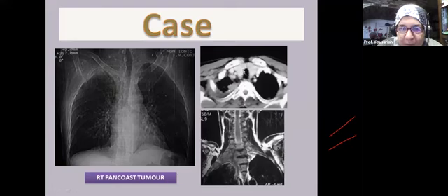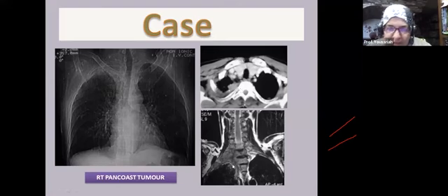Now, if you look at the axial CT image, there is what looks like irregular pleural thickening, which is very much understating the lesion. While in the same patient, MRI showed the lesion extensive in the thoracic inlet, invading the adjacent spine and extending into the apical aspect of the lung. Again, we stress the point: in cases of thoracic inlet lesions and chest wall lesions, we must do MRI. In posterior mediastinal lesions, as we said before, again, we must do MRI.